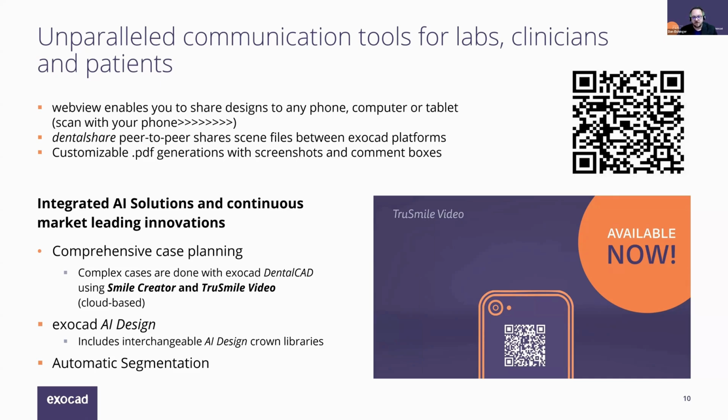That's part of the True Smile Photo AI service. And then also the rendering of this. It's photorealistic rendering, where it basically captures a rendering on the 2D image of the patient's initial smile photo, and then replaces their teeth with your design and matches the rendering from the photo. It looks very realistic, and we're getting a lot of great feedback from that.